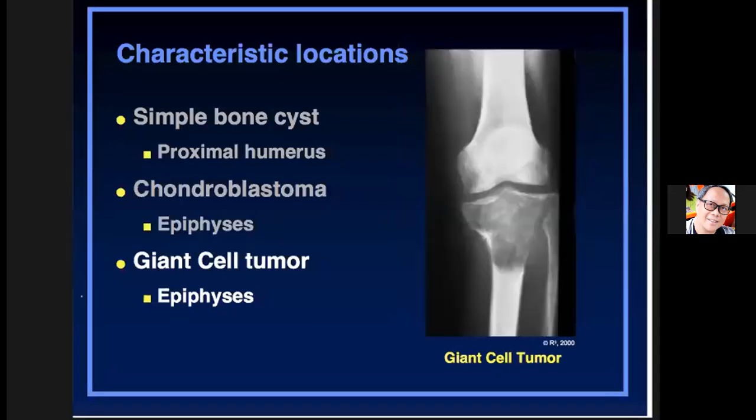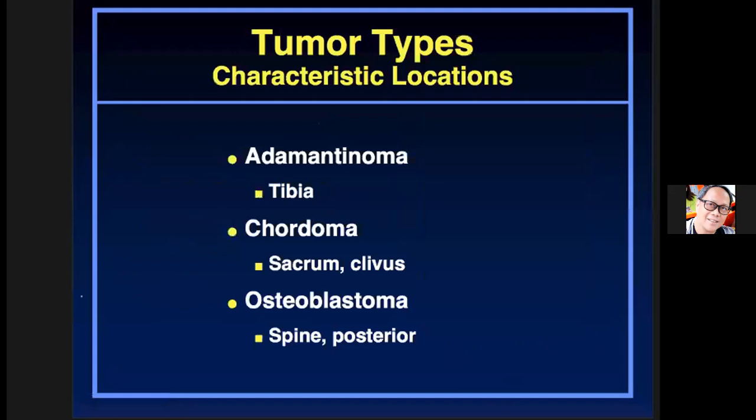Okay, so giant cell tumor again, the metaphysis and epiphysis of what bone? What bone do you think is this? Tibia, doc. Yes, the proximal tibia, and the proximal fibula also doesn't look normal, no? Okay, so adamantinoma usually is seen in the tibia.